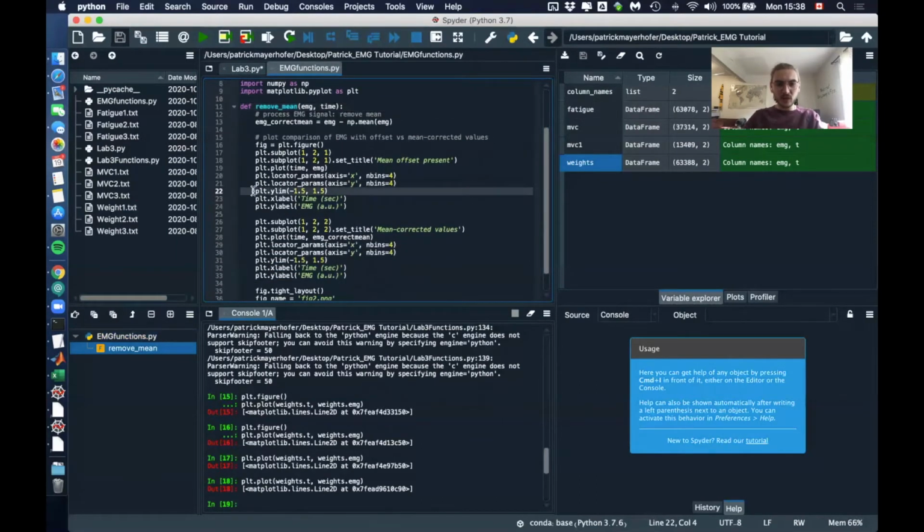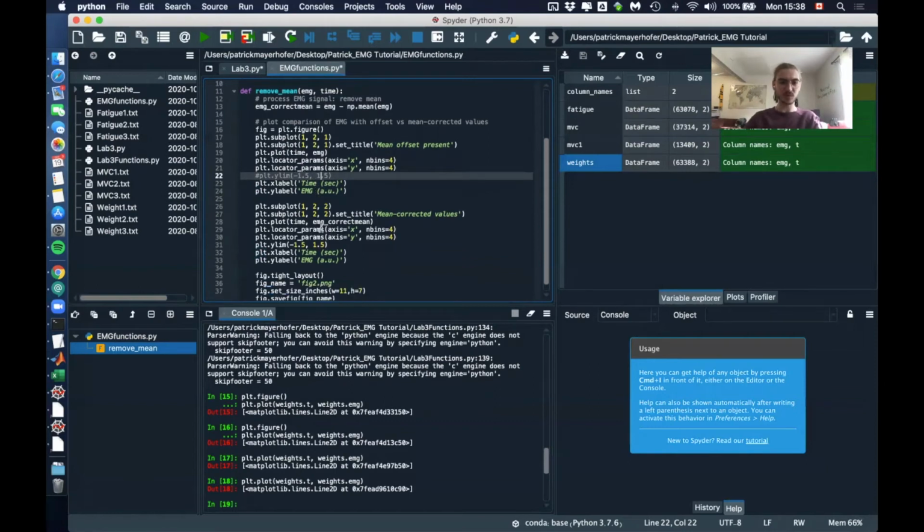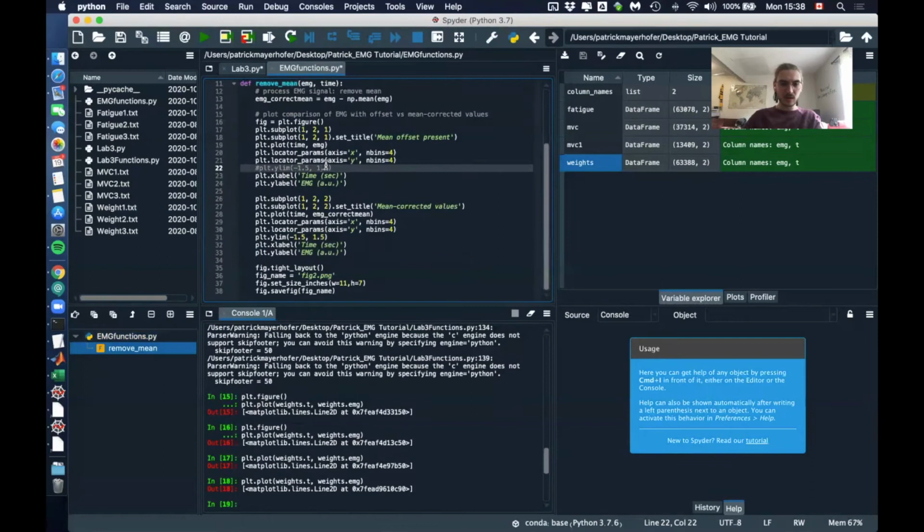One thing that I also like to do is I want to comment out the y limit, because this means that the y-axis can just go from minus 1.5 to plus 1.5. Our axis will be higher because our values are, I don't know, between 305 and 330 or whatever, which means we have values up to like 25 or so on. So we don't want to have minus 1.5 and plus 1.5. And here as well, let's comment this out as well. And now let's see if that will work.